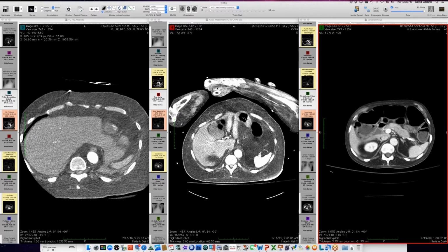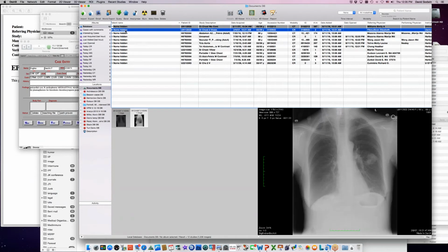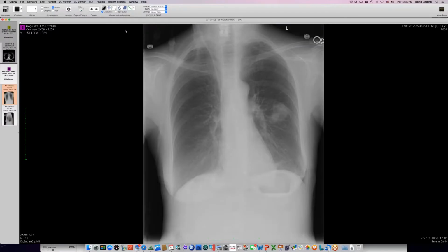Let me see if I can pull up the previous case here. So let me show you this. This person is a woman who had a kidney transplant in 2000 for polycystic disease of kidneys and liver. And she visited the San Juan Islands off the coast of Washington State. And this is an area that's famous for Cryptococcus gattii, the species that likes the Vancouver, BC area and Washington State and loves the islands.